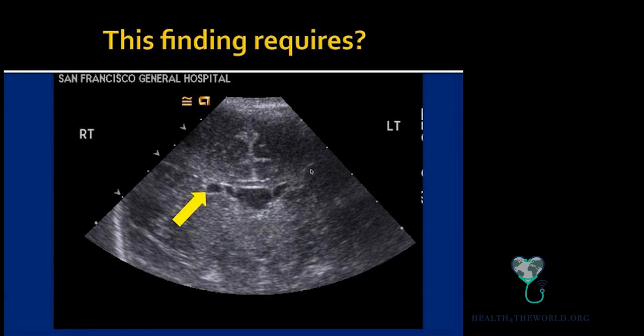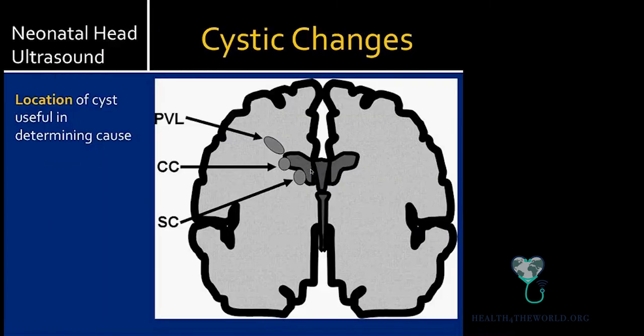All right, question here. We see this commonly, and our sonographers ask us, is this something abnormal? What would you think if you saw this image? Do we need a follow-up? Should they get an MRI? No further follow-up, and I'll tell you why.